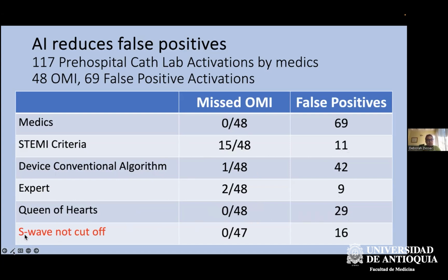And then there's the case when the pre-hospital EKG cuts the S wave off, which makes it hard for the Queen of Hearts to make the diagnosis.